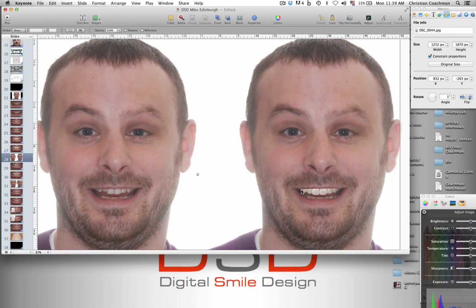Or you can click on all the teeth, for example. You can select all of them. And if you group them, you can intrude them or extrude them and show to the page. Or you can twist. If you're not confident about the cant, degree by degree you can play here until you find the position you like.